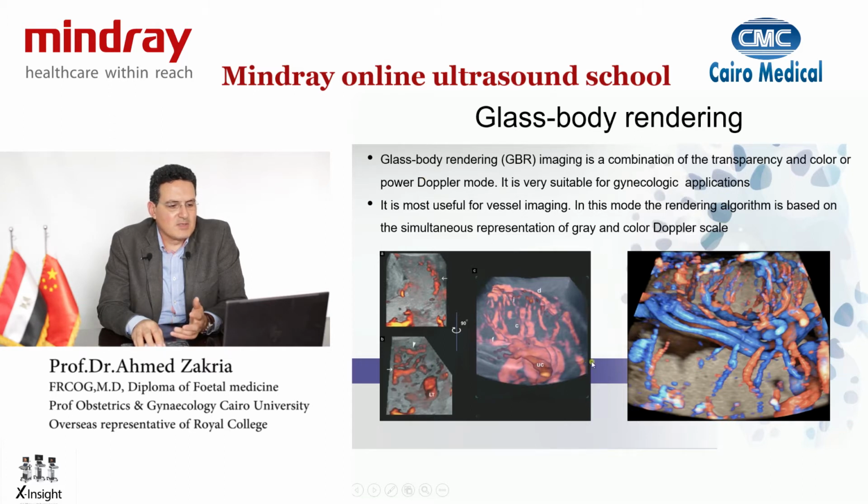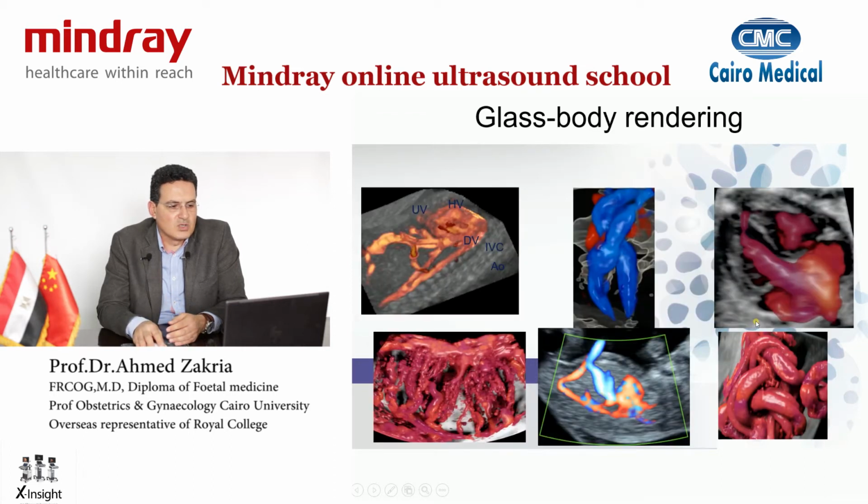It can sometimes be helpful in defining structures of placentas or areas when you want to see how much vascularity is there. And not only that, by using the color Doppler volume imaging, you can obtain some indices of the amount of vascularity going to those tissues, like what we call the vascularization index or flow vascularization index, which can give you an input into how much vascularity is there, for instance, in tumors, in placentas, or in areas where you're suspecting invasive placenta.